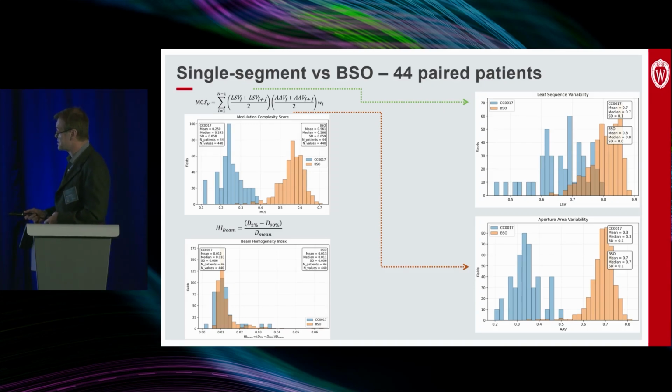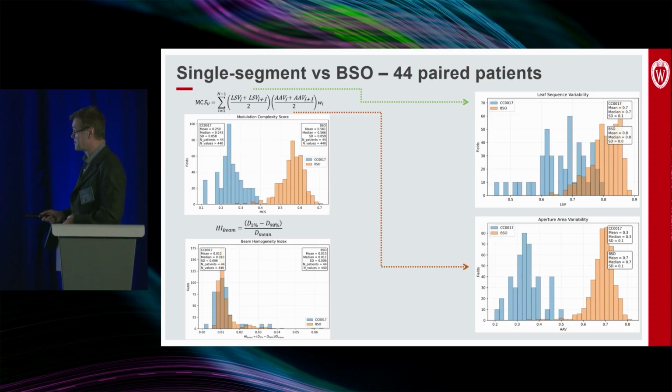And so you can see that there's like a bimodal distribution immediately in the standard plan. So these are just one beam that's been optimized to give you 0.2 gray versus the beam-specific objectives. And what that's of course saying is that the beam-specific objectives are considerably less modulated than the single plan, and that's because this single beam has to be doing a lot of work in the optimization when it's the only variable there. So this is just a breakdown of the two terms here.